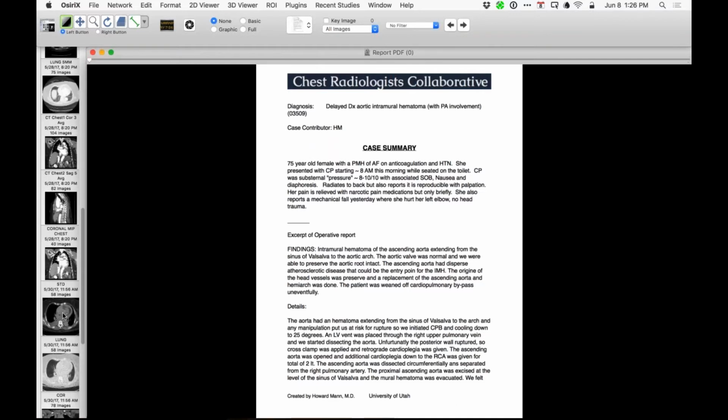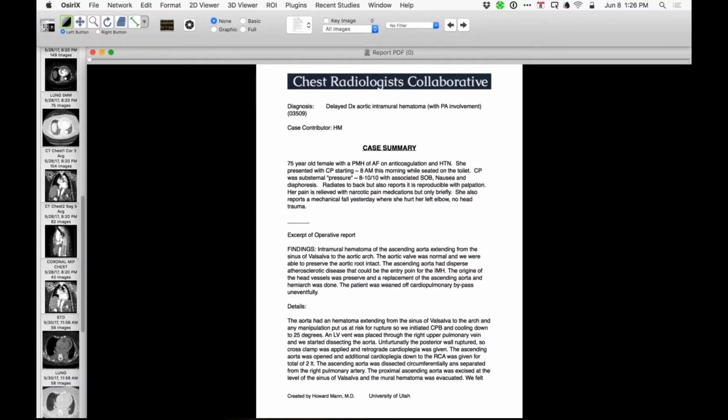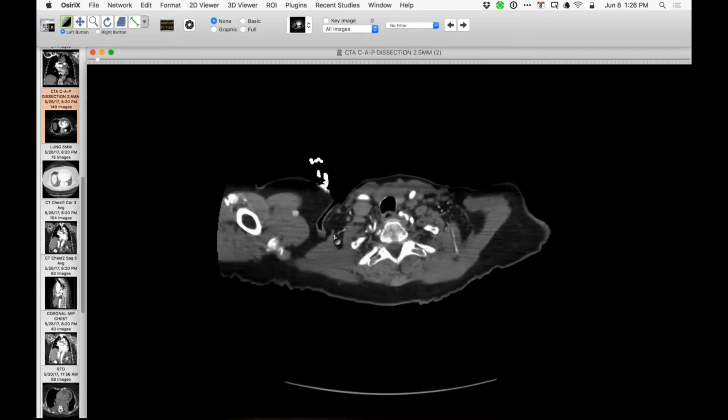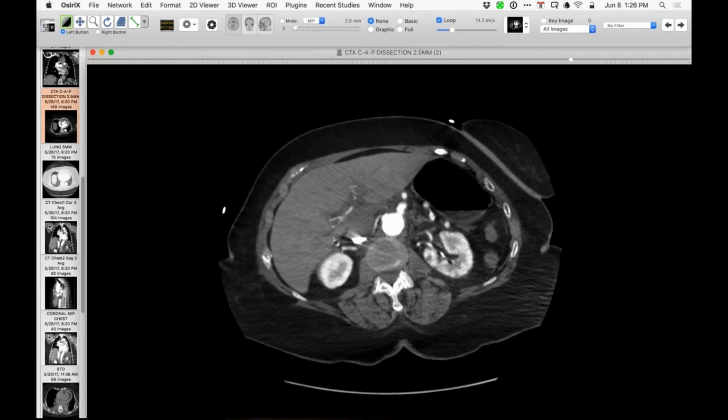Any thoughts about the kidney, by the way? That focal abnormality involving the kidney? Was there any narrowing of the renal artery? Yeah, there was some irregularity there, which they suggested was some kind of fibromuscular dysplasia or something there. So there is something wrong there.